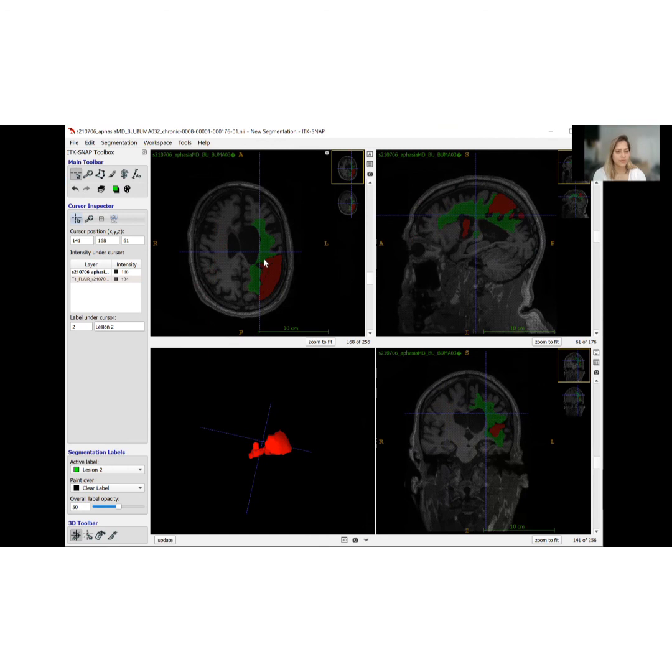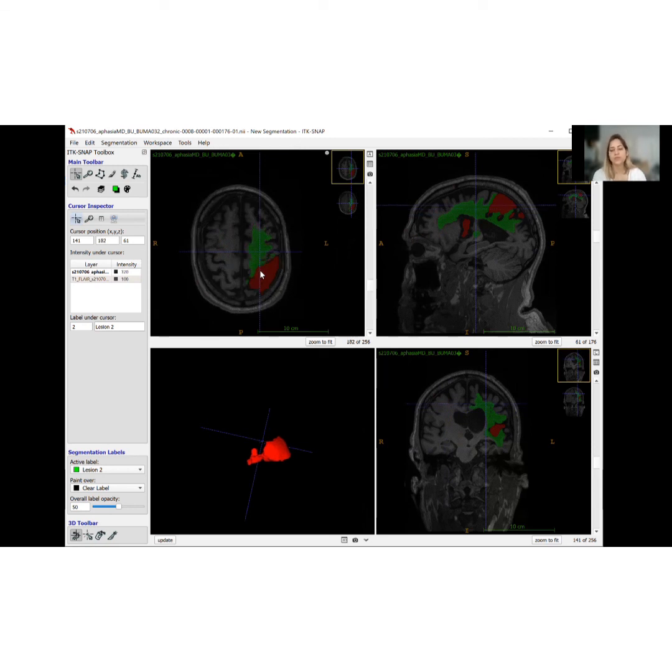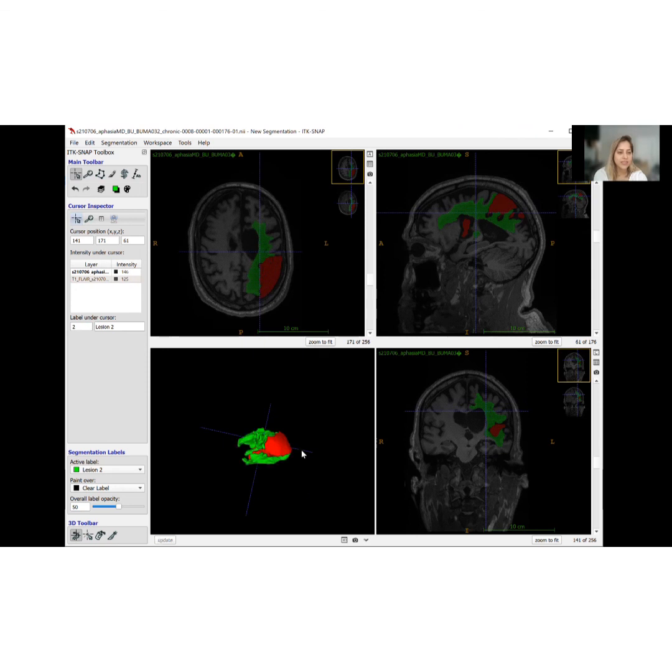So there are some little gaps in here that we can either address by going back and rerunning one or the other of these, or with just some manual editing. Yeah. I mean, if you update the shape now, like the lesion map, update that down there, and so you can see. Yes. So this is actually our lesion map.